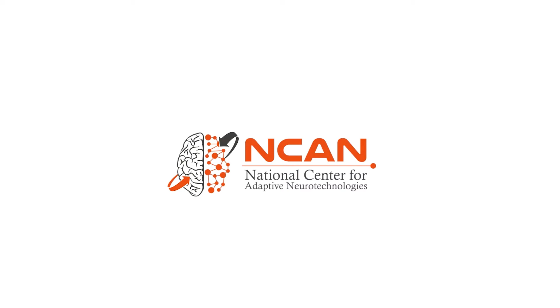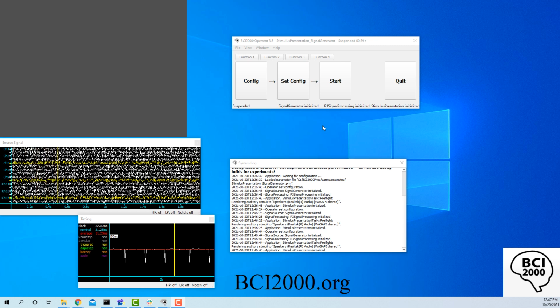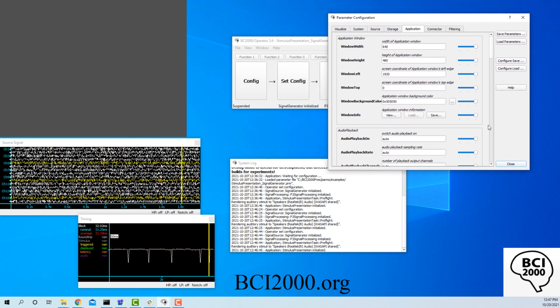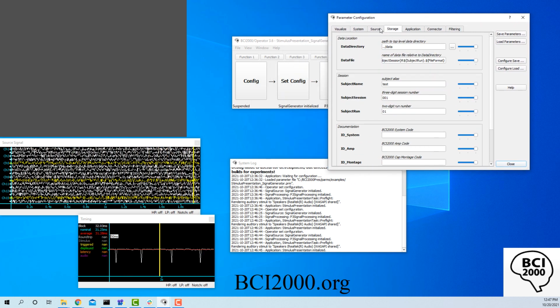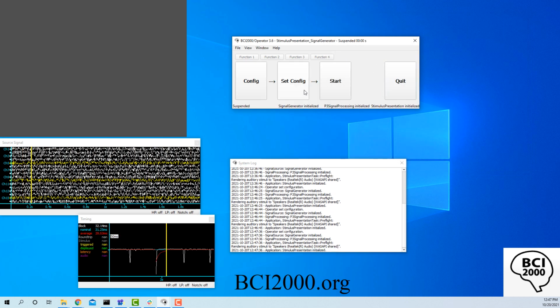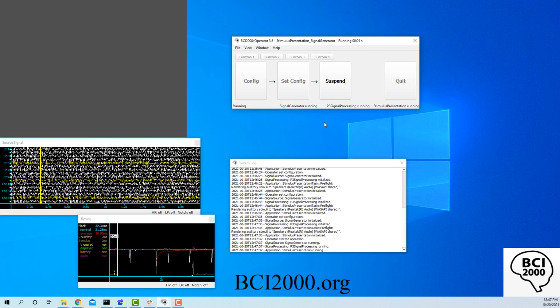Hello, and welcome to our tutorial video demonstrating the integration of BioPac MP160 with BCI 2000. In this video, we will discuss the necessary steps to connect your BioPac amplifier to BCI 2000. BCI 2000 is an open-source, multi-purpose software tool for real-time biosignal acquisition, processing, and feedback.